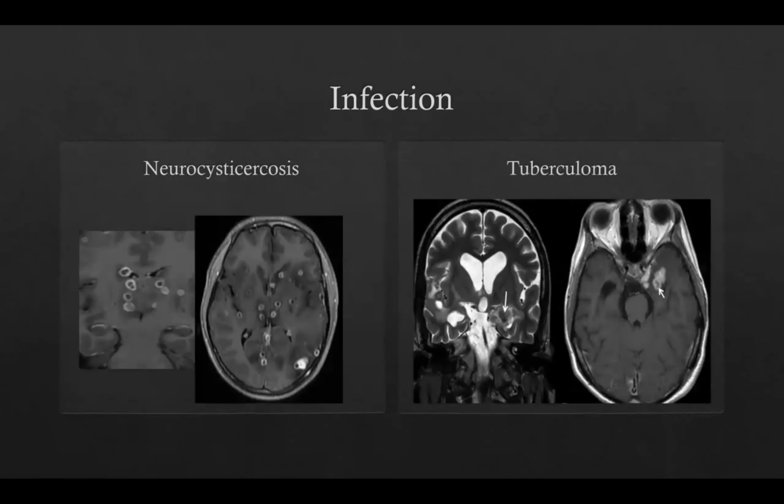The other infection that can also be associated with seizures is neurocysticercosis, where you might be able to see the eccentric enhancement, which we call scolex, usually appearing during the vesicular and colloidal phase. And rim enhancing lesions, which are more common in Malaysia, are also tuberculoma. Especially when you see it at the basal cisterns, think of tuberculoma.